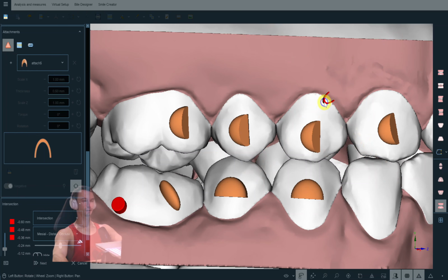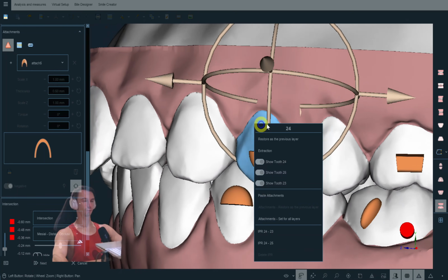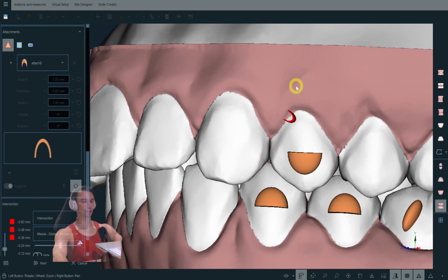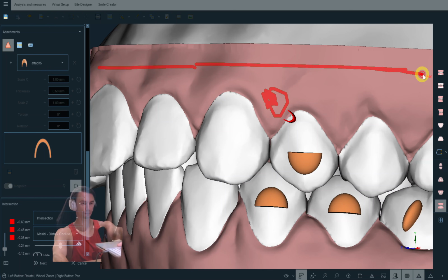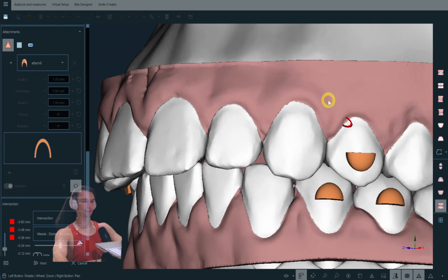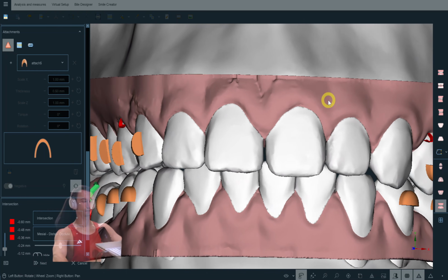So it means we make a cutout here, or, which is much better, we make a button. We just take some special pliers and form a button here. This is the way we cut the aligner. So this is the plastic. We take the pliers and we make a button here, so it will look like that. There's going to be this kind of button. There are special pliers or other techniques which you can also use.